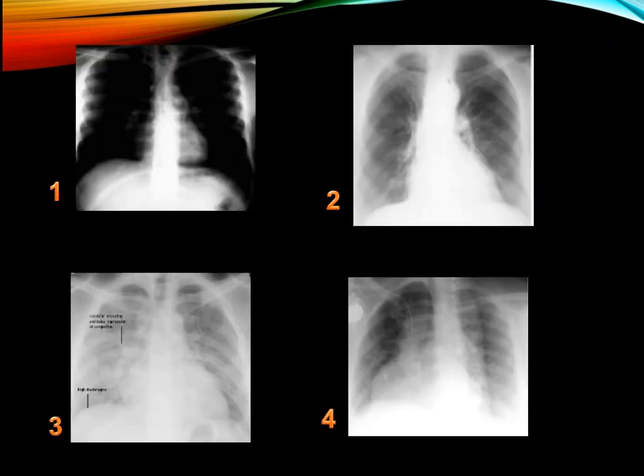We have here 4 chest x-rays with certain technical problems. This may falsely give impressions of an abnormal chest x-ray, while it's in fact only a technical problem. You should look at the chest x-ray and determine what the problem is in the technique.